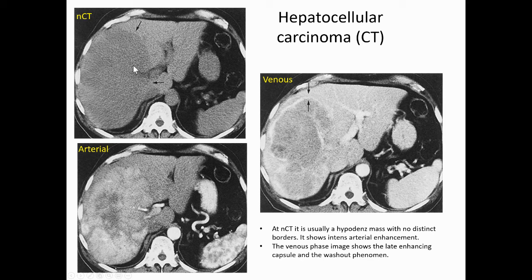If there are bright areas, then that could signal to you the presence of copper, as I have said before. Or if you can measure the lesion and you can prove that there is fat in it, then that all adds further proof to your diagnosis of HCC.